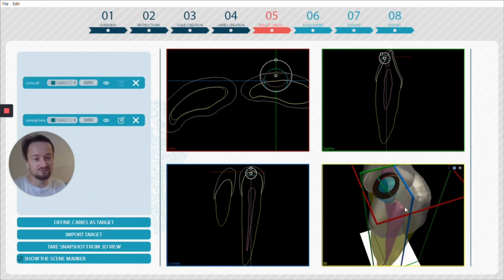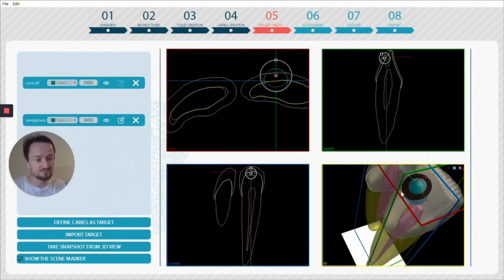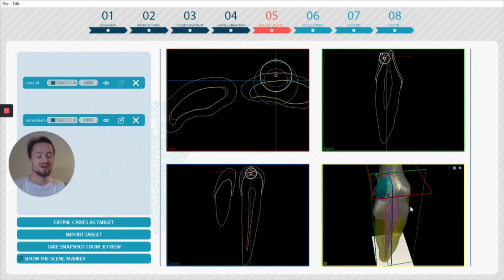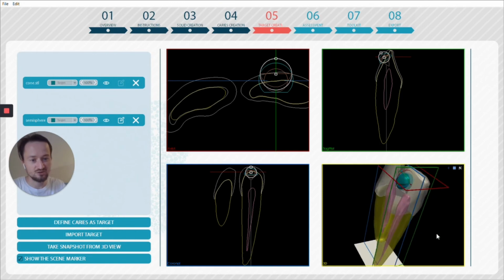And in my 3D view, you'll see this multicolored gizmo going through. If I click one of the arrows at the end, I can actually enlarge it. So then I'm asking the students to remove a surface that's slightly larger, or here much larger, than the model of the caries. So again, just click, and then click again and drag to change the size. So I'll make that slightly smaller. And just like before, you can actually change the position as well. So I'll bring that up just so it sits nicely on the surface there.